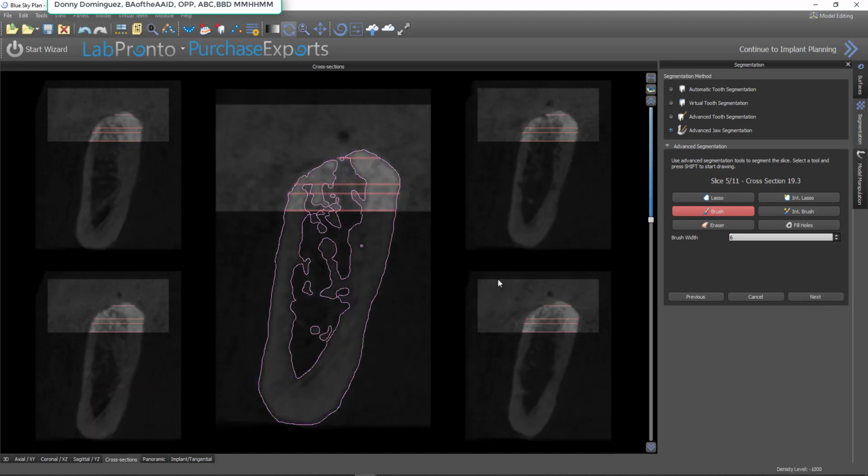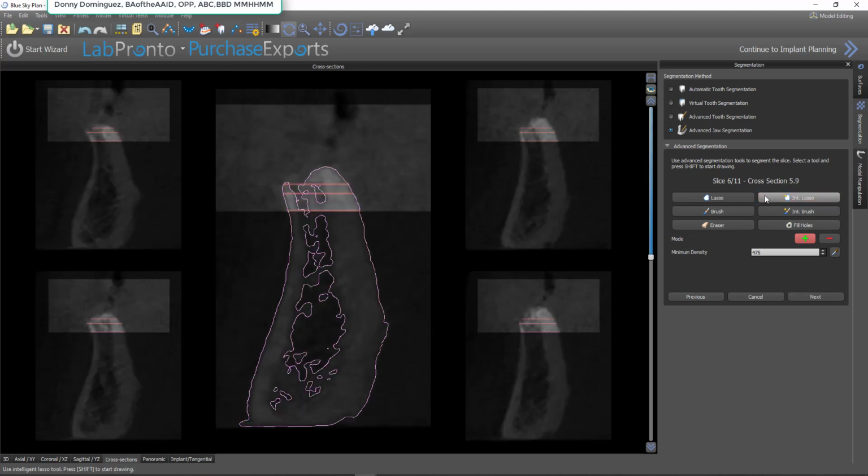Alright, so now you see how I also have this as an upper boundary. So it's just going to make this go a lot more efficiently. Those are slices we would have gone back and done anyway. And now my fill hole function is a lot more effective, and that means less overall work.